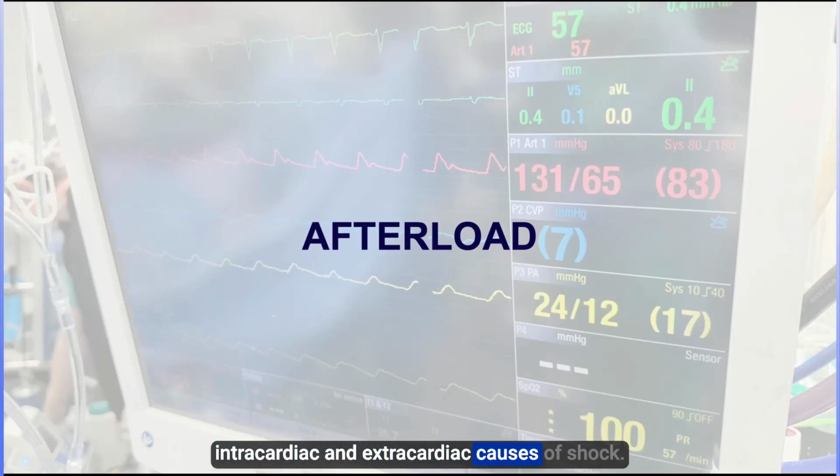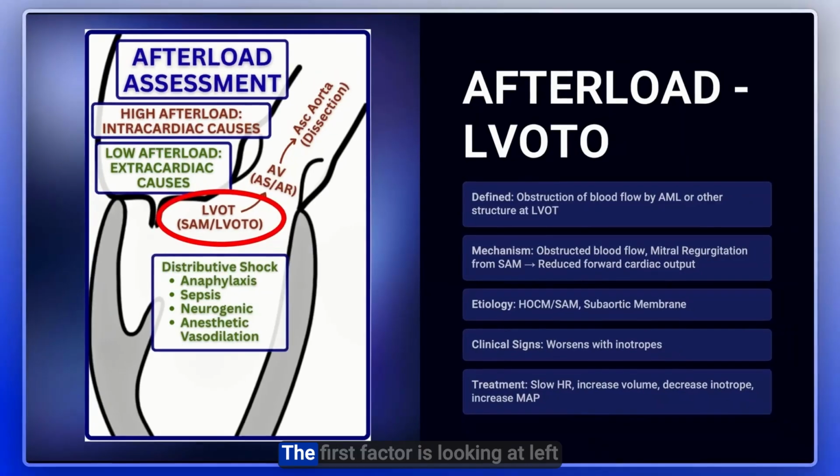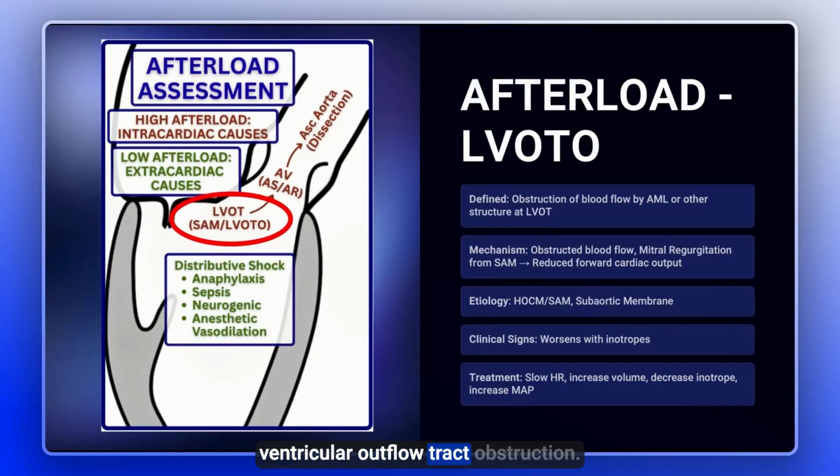The final cause of the shock state that we want to look at is afterload, where we have intracardiac and extracardiac causes of shock. What downstream non-LV factors are negatively influencing transport of blood to get to the organs? The first factor is looking at left ventricular outflow tract obstruction.